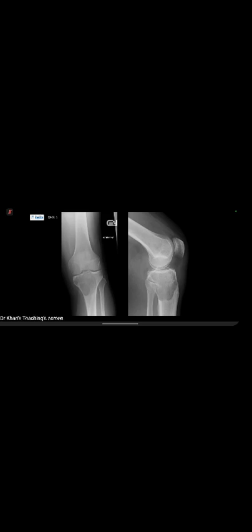Now, candidate one correctly identified there is some thinning, but actually there's some periosteal reaction along that medial border of the proximal tibial metaphysis, which is slightly concerning. So the GCT itself can be locally aggressive, and it's important to look for some of those aggressive features. 75 to 90% occur in the long bones, predominantly in older people, so 30 to 50, and they originate in the metaphysis and extend to the epiphysis and often abut the subarticular bone.